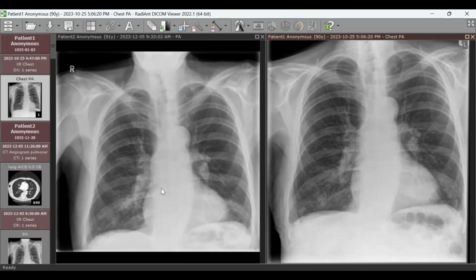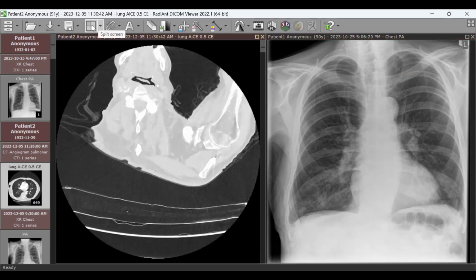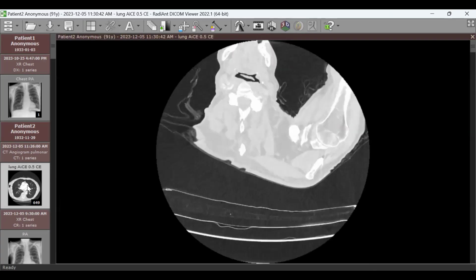It could be suspicious of, and as we said, the acute embolism caused expansion of the vessel and caused more density. So this is what's on the X-ray. So you'd like to do a CT scan for this patient, of course. Yes.